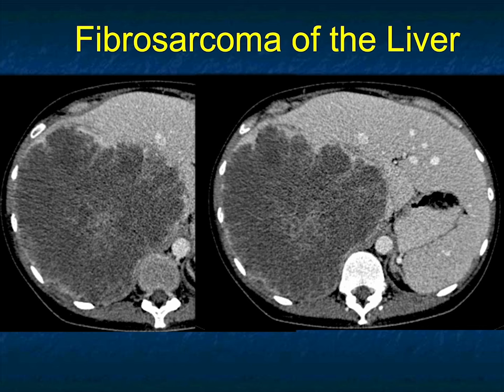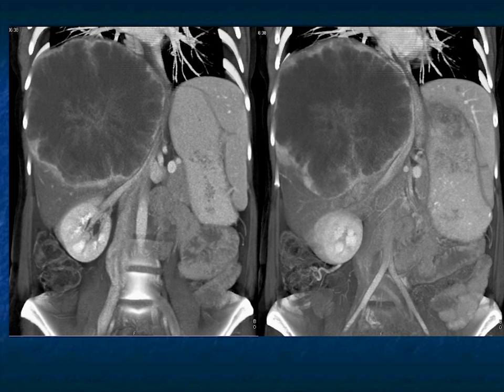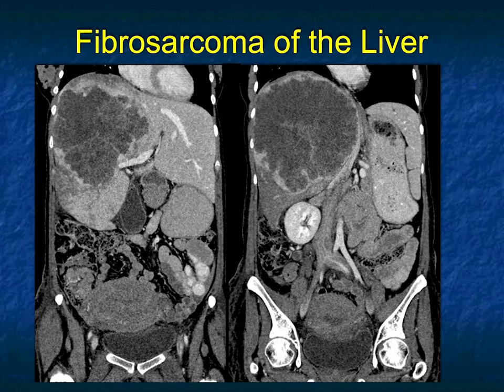Angiosarcomas are usually vascular. This ended up being a fibrosarcoma. That's pretty unusual. Large, enhancing, necrotic tumor. Hepatoma to me is the best thought, but sarcomas do occur, and this was a great example of a fibrosarcoma of the liver. I think I've seen like 2 of these cases.